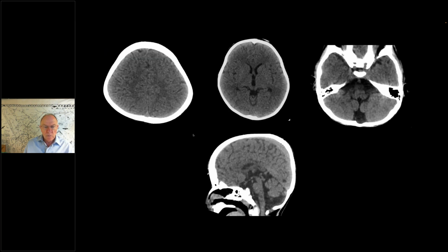So we have a CT and MR, done with, I think, a one day gap. On the CT, I cannot appreciate any abnormality. In particular, I cannot appreciate any calcification in the deep brain nuclei. Overall, a normal appearance of the supratentorial brain parenchyma, maybe a slightly hypoplastic vermis, and slightly reduced volume of the brainstem, in particular the midbrain. But supratentorially normal, no calcification, no hemorrhage.